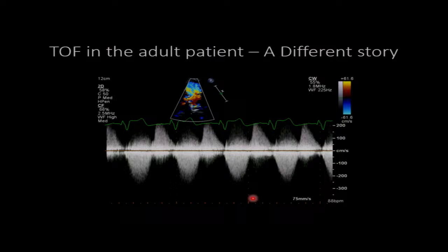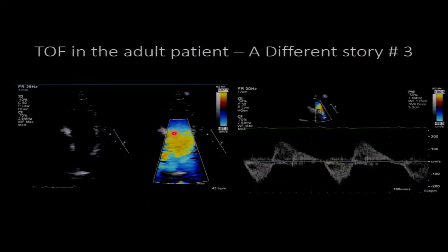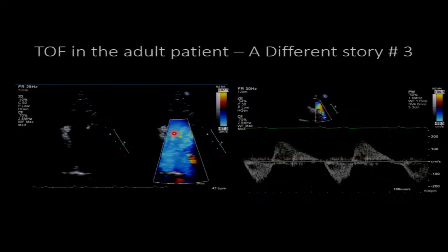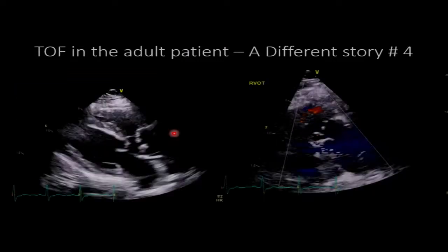Yes, you need to say it louder. I cannot hear you. Oh, that's right. Yes, and the envelope. You're absolutely right. And then usually the PR envelope looks like what geometrical figure? Trapezoid. And in severe PR, it is a triangle. That's right, just like you see there. It's important to look at the main PA and the branch PAs, and assess there too.